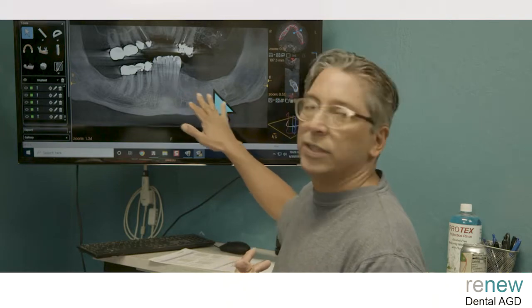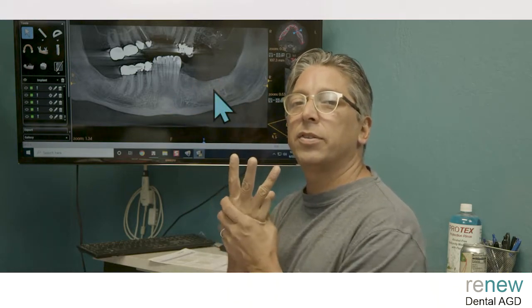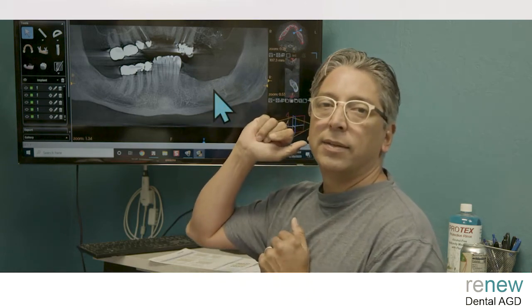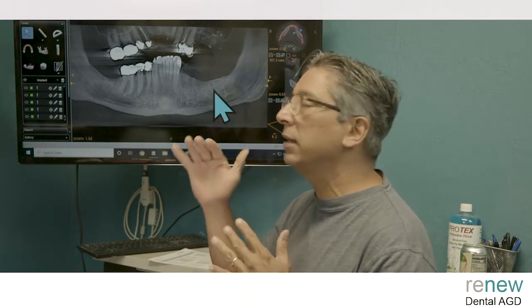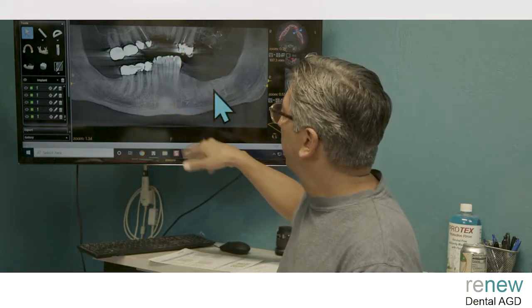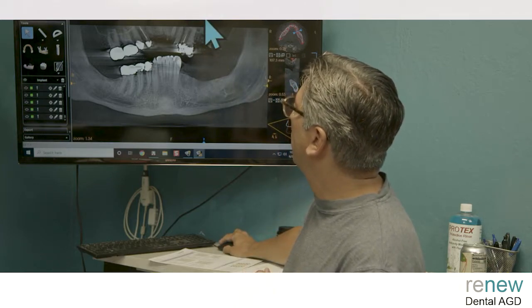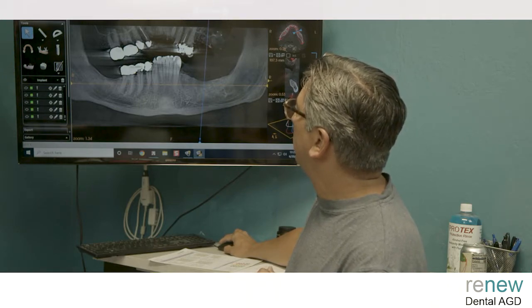So we're looking at this area here from the canine back. We're looking at 3 particular teeth here to restore, tooth numbers 19, 20, and 21, to get the primary occlusion back. He has the premolars here, and he's going to get the molar here, and we're going to restore the upper. But in particular, we're looking at where those would be and where number 19 would be, because you could also do 19 to 21 as a 3-unit bridge.